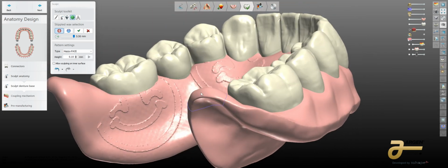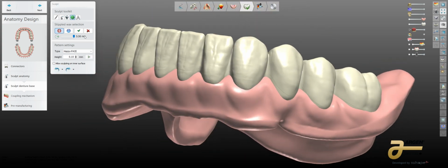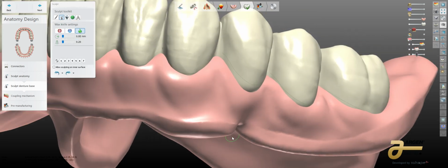There's tons of things that you can do to add these things. I have tons of different attachments and fun stuff to do on these things. And again, it's only limited by your imagination and your desire to do something more.